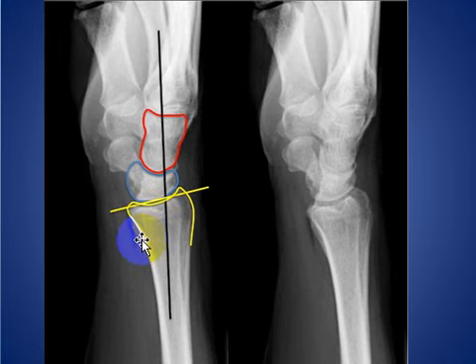Articular surfaces of the radius, lunate, and capitate should be in a straight line and be congruent and parallel. The apple is the capitate here, which should sit on the cup.